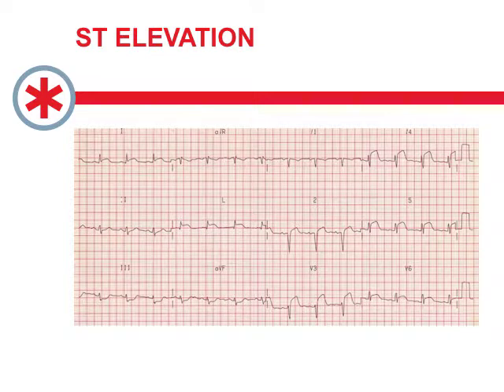So if you see ST depression that looks like it is anatomic, then you should be looking in those reciprocal leads for an ST elevation MI. And anyways, the ST elevation that you see here is sort of the classic upwards sloping, downward sloping ST changes that look worrisome for an MI for sure.